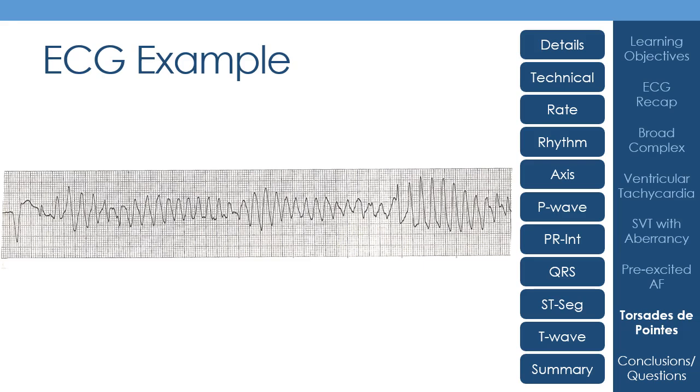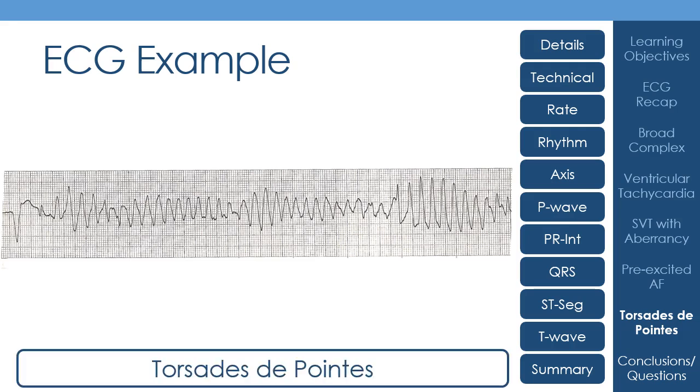And this is exactly what I was talking about in those previous slides. So you've got this little area that's just suddenly depolarized within the T wave. So during the T wave is the ventricle repolarizing. So you've got some area of cells that is ready to depolarize again. And you then set off this whole arrhythmia from that. And so this is torsade de pointes.